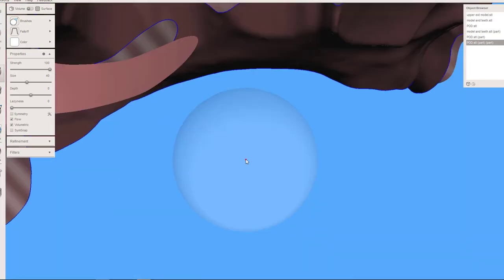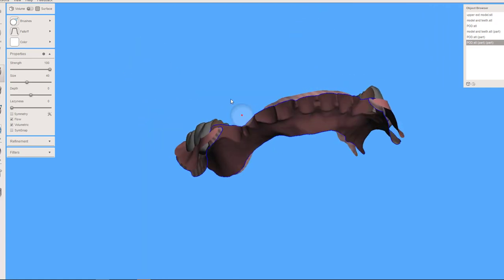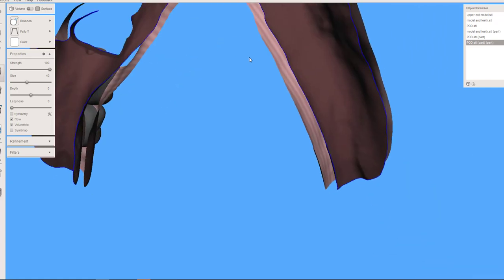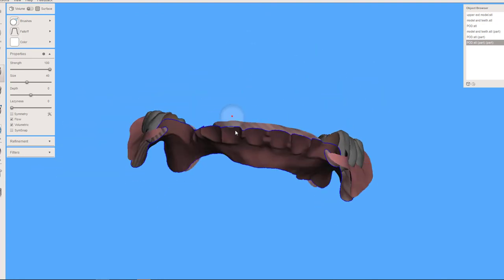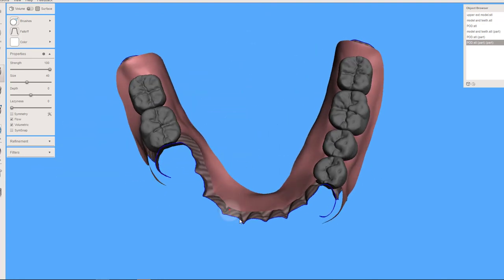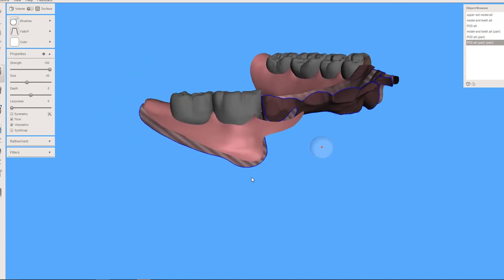There we go. Now, I've done these before where I would maybe offset the clasps first. That way I can really easily control a consistent thickness with those. But honestly, you're just as well to do them thick, like we did, to 2 millimeters, and then just come back and grind them down again, because this material does adjust so easily.